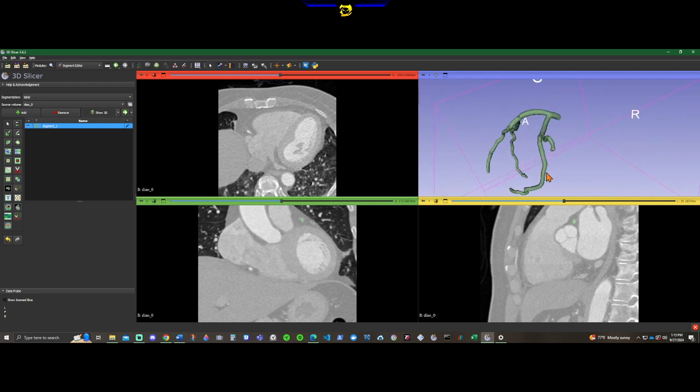So now that we're here, we're going to follow through a couple steps. The first thing we have to do is clip the ends of this artery before passing it into SimVascular. Typically, if we didn't have a label, we would start to segment and everything, but that's a story for another video. Since we already have the label, we're just going to be working with them. So let's go on and export this by clicking this button.